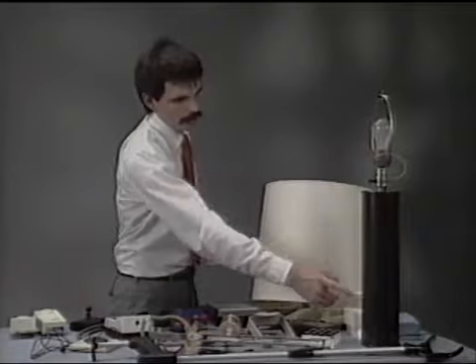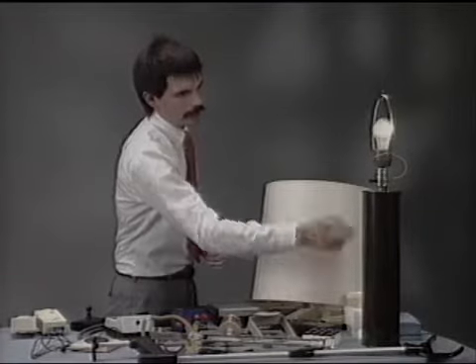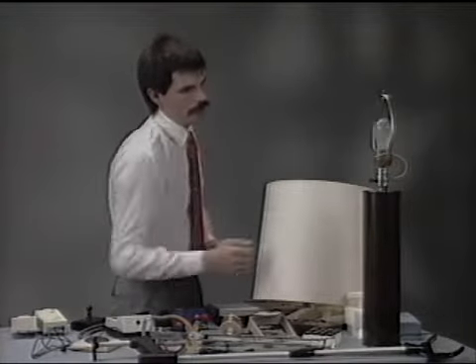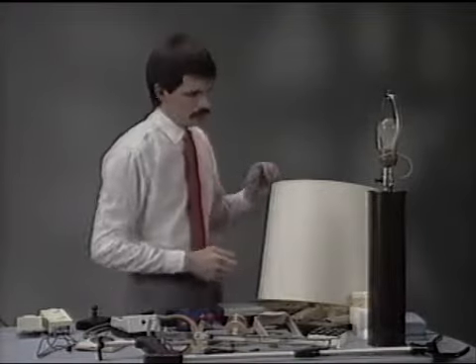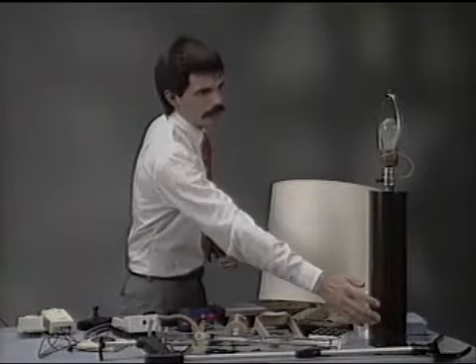And now when I touch it the first time, I get a low beam. My second touch, I get a mid beam. And the third touch, I get a high beam. And of course, the fourth one turns it off. And this is a regular one-way light bulb that's turned into a three-way light bulb using this very inexpensive module, and it allows someone who can't turn the small knobs here to be able to activate this light just by touching the base.